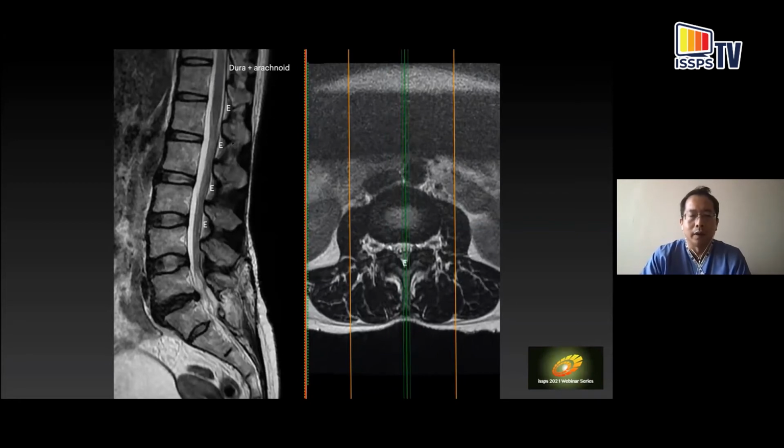Now, I draw your attention superiorly now, because at L5, the canal is slightly narrowed and tapered down, but as you go slightly higher up, you get more and more space within the spinal canal. The epidural space increases in size, and you can start to see the dura and the arachnoid layers coapted together to form the nice boundaries of the thecal sac over here. Beyond this is the spinal canal. So epidural space, dura, and arachnoid, and then the subarachnoid space where you would be performing a spinal tap, for example.